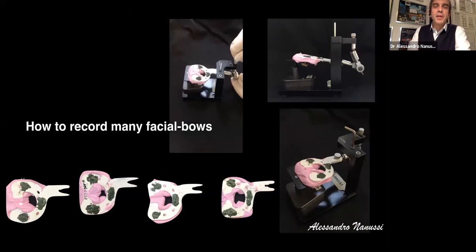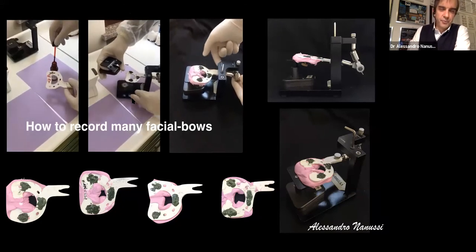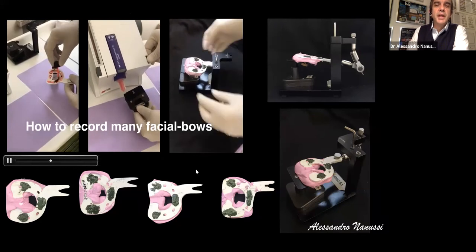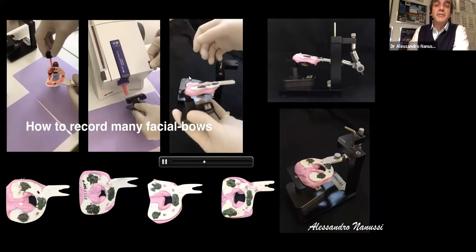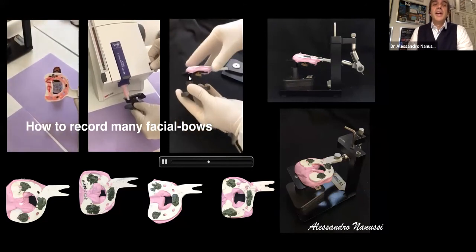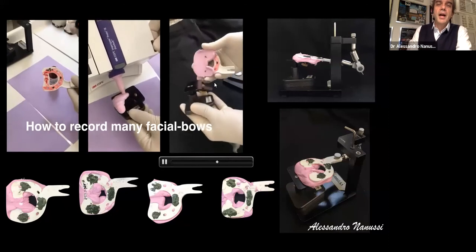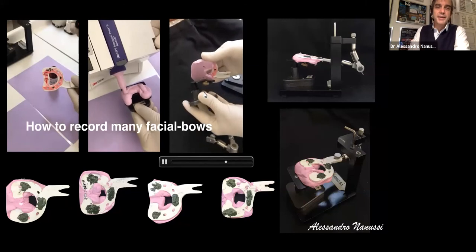It's simple. You don't use stone to lock the facial bow, but silicone, and then you can reuse the bases, which are very expensive. In my clinic, I don't have 10 or 20 bases for the facial bow. And now the base is ready for a new facial bow, okay?